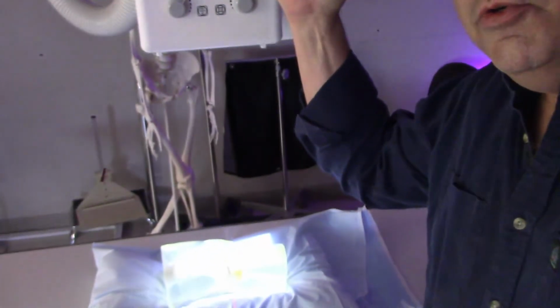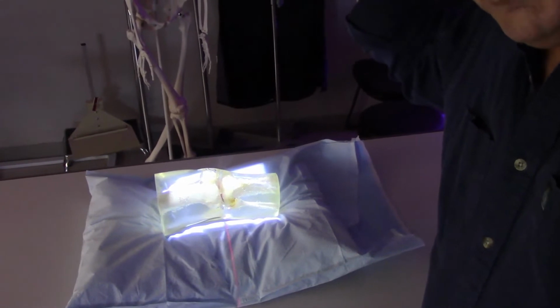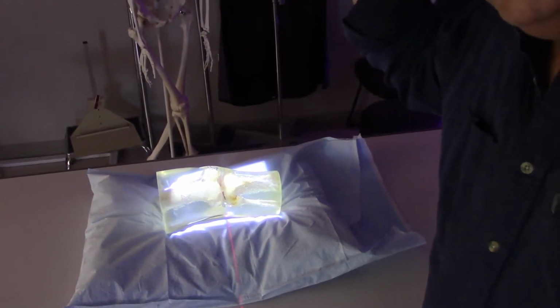What I've got is an X-ray tube at a 40-inch SID, detented to the table, and let me introduce you to our patient. The patient du jour is the knee phantom. We're going to take some images of this knee phantom using 65 kVp and a variety of mAs values. We're going to start at 1 mAs at the low end and work our way up: 2, 4, 8, 16, and all the way up to something ridiculous. Our final image will be taken at 288 mAs at 65 kVp.